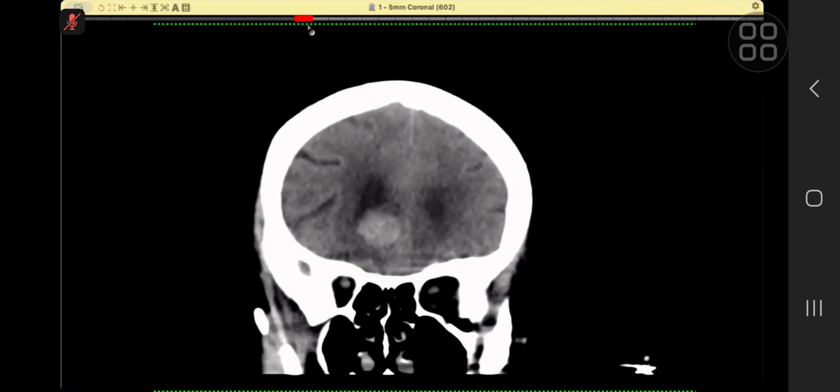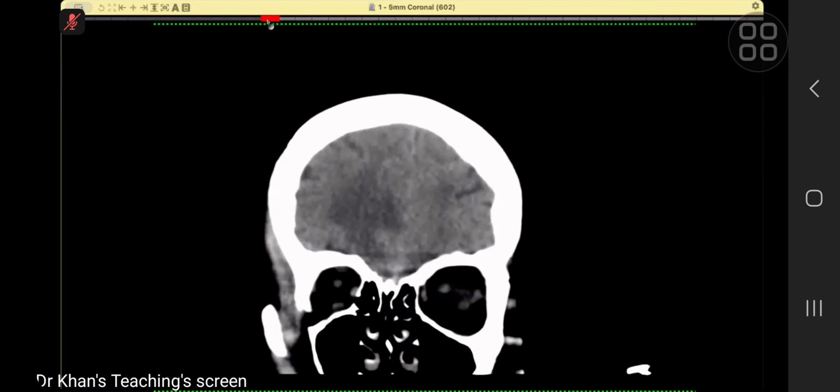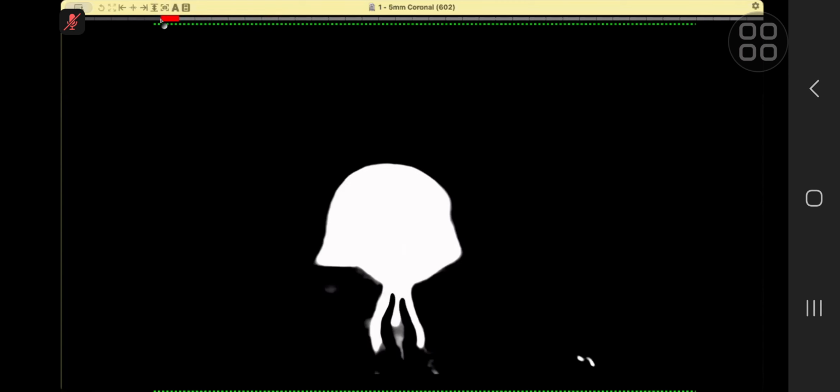There is evidence of, sir, the bleed in the right frontal region, in the neuroparenchyma. This is not a classical site for a hyperdense bleed. Usually the hypertensive bleeds are seen in the basal ganglia and thalamus.